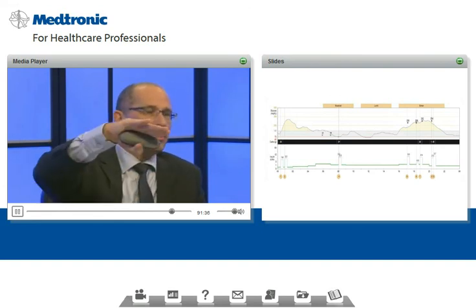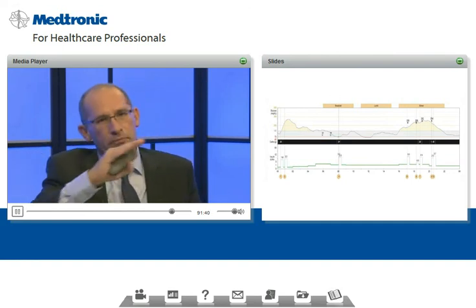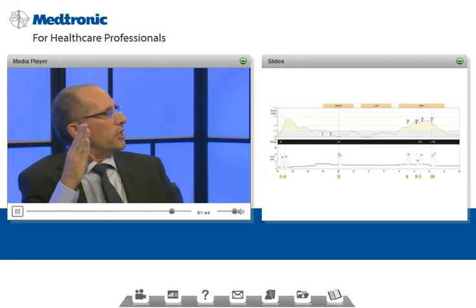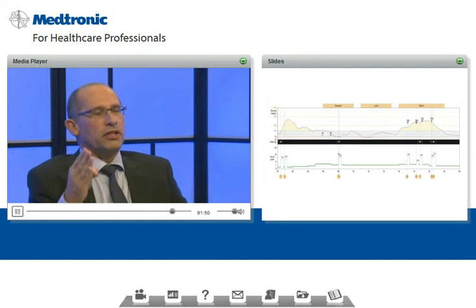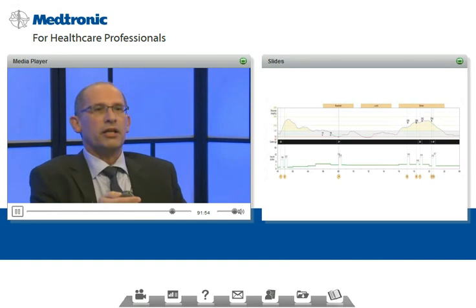And this sharp increase is usually a meal-induced increase and not a problem with the basal rate. So just looking at the downloads, they pinpointed a problem with this patient, and that is to try to inject the insulin prior to the meals or even a bit earlier in order to improve the patient's control.